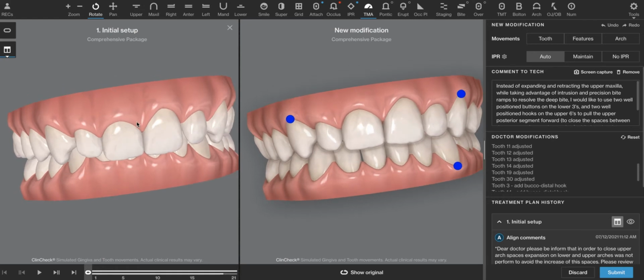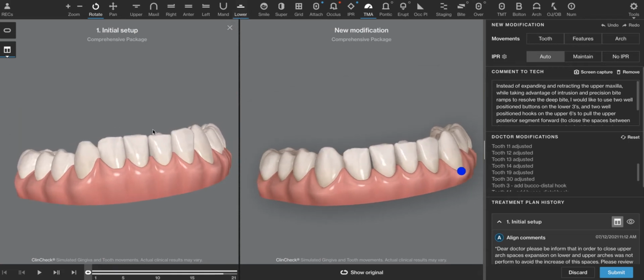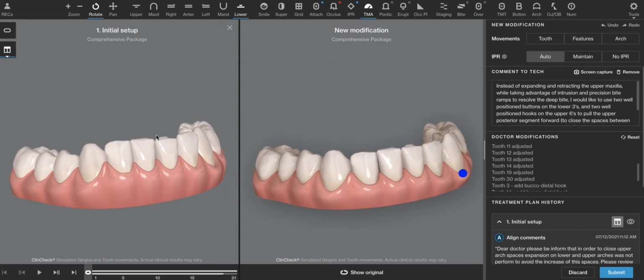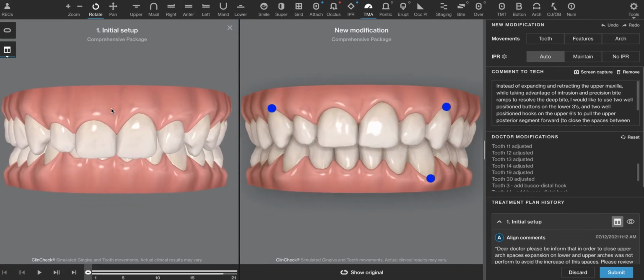Therefore, if the maxillary segment seems to be in place, we would expect to see an elevated or exaggerated curve of Spee with the anterior teeth super erupting. Why is this important? Well, we want to be able to fix towards where nature had intended. So if we're going to fix the deep bite, we're not going to necessarily want to intrude the upper teeth. We may decide to do some of that, but that's not necessarily the problem.